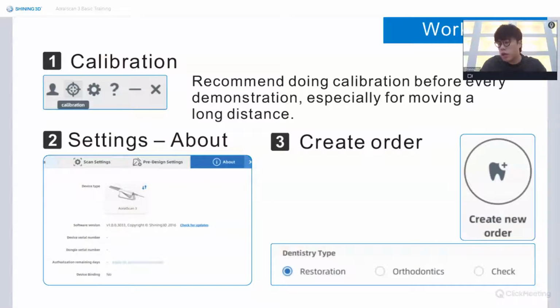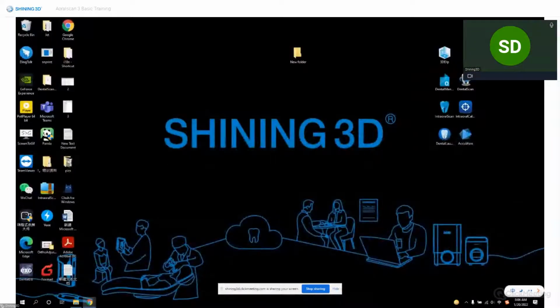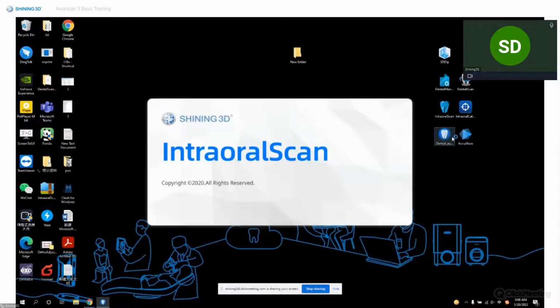Because the network is not quite stable, I will turn off my video while I am scanning. Sorry, guys. So let's run the software.